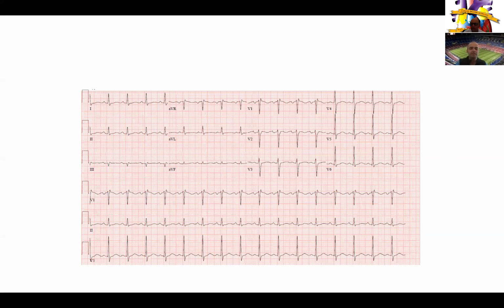The PR interval looks normal. But the P wave looks a little bigger, so maybe he has some left atrial enlargement. The other thing to note is his heart rate is a little faster than you'd expect, probably 100 beats per minute. He has an incomplete right bundle, but nothing else. So this is a patient in whom you haven't seen the manifestations of complete heart block or prolonged PR yet.